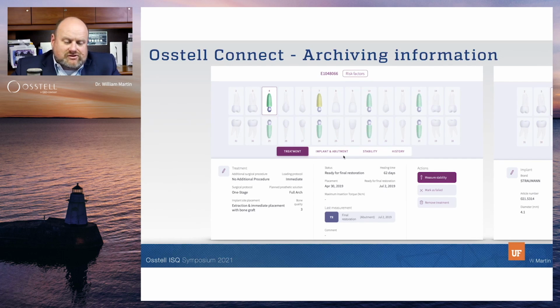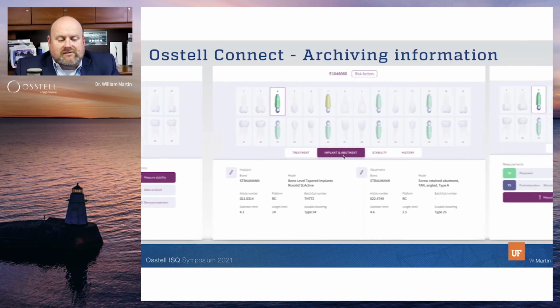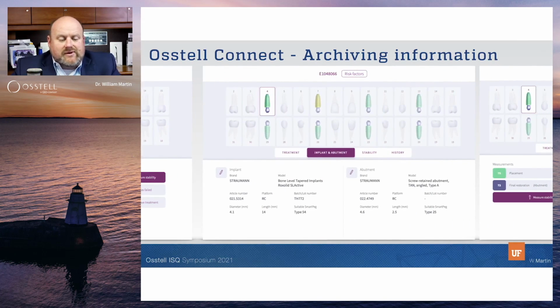And it captures the last measurement being blue means it's an abutment level measurement. We have the information of the implant there. We have the information of the abutment there. We have the lot number of the implant there as well. So we know the specific implant that was placed.